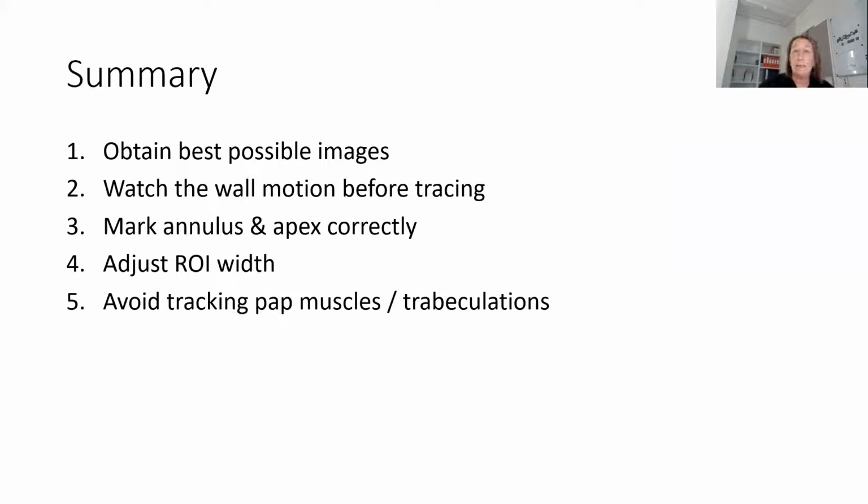So in summary, we need to first of all obtain the best possible images, watch the wall motion before tracing, mark the annulus and apex correctly, adjust the region of interest width, avoiding the pericardium, and avoid tracking any anatomical structures.